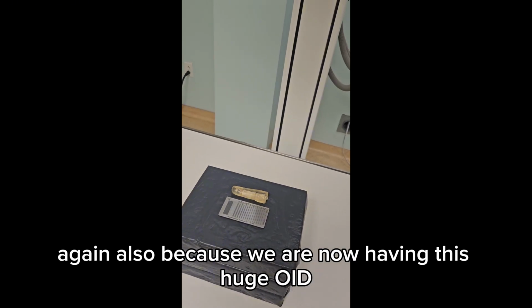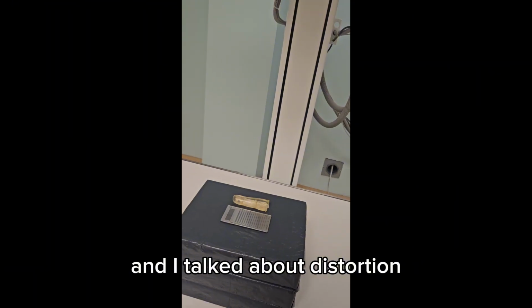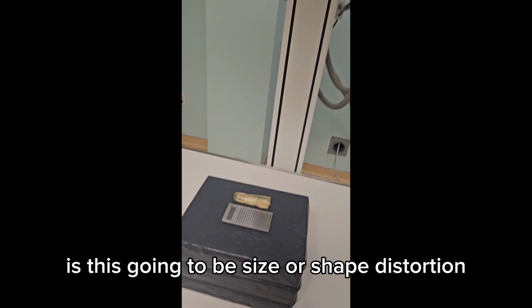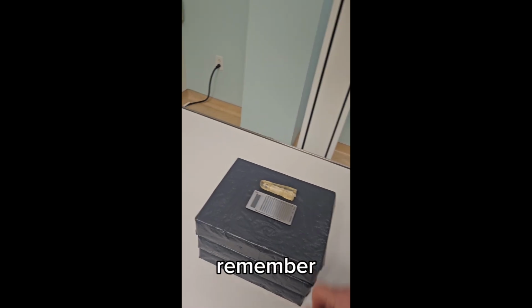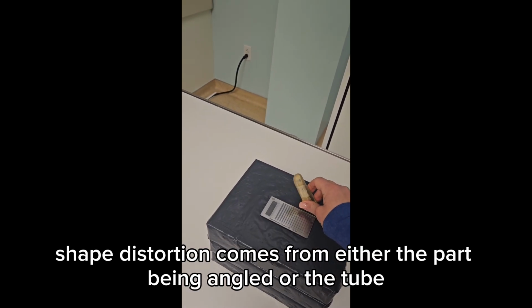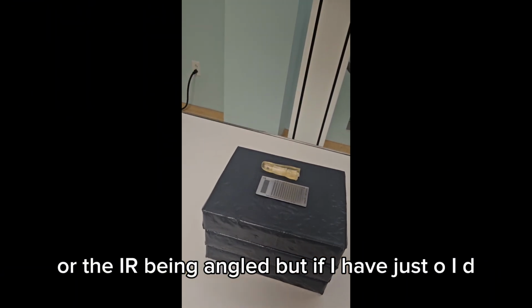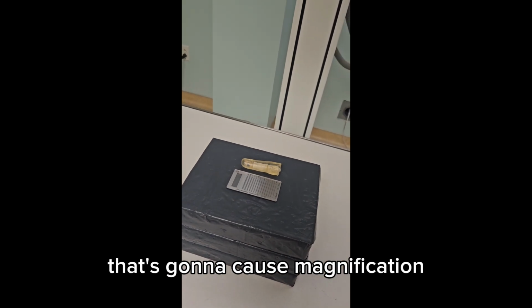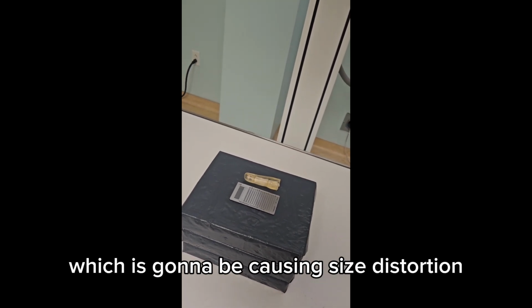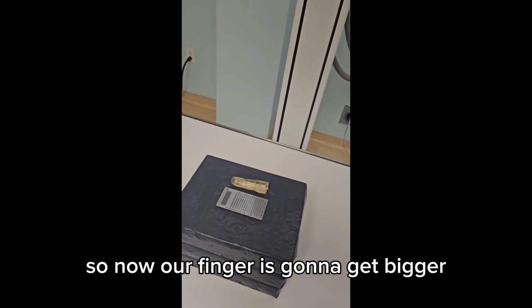again. Also, because we now have this huge OID, and I just talked about distortion, is this going to be size or shape distortion? This is going to be size distortion, right? Remember, shape distortion comes from either the part being angled or the tube or the IR being angled. But if I have just OID, that's going to cause magnification, which is going to cause size distortion. So now our finger is going to get bigger.